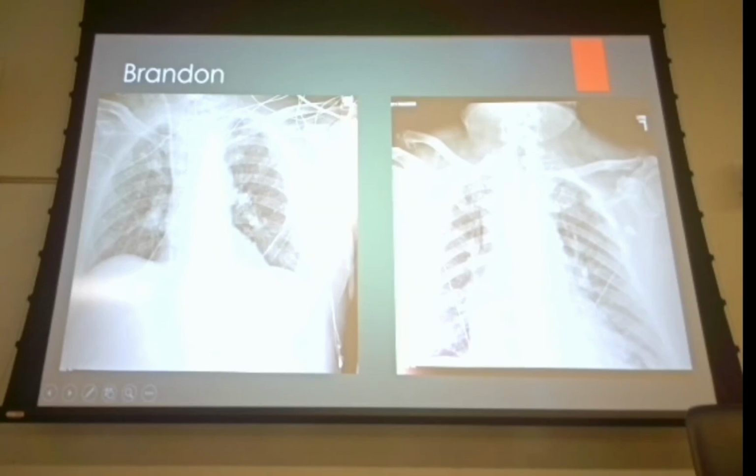Are we just looking for the central line placement? If the answer is yes, is that a repeat? Well, we can see the position of the central lines, so probably not. It'd be kind of embarrassing to turn that in. We've got rotation. So does rotation affect central line placement? No, not really.